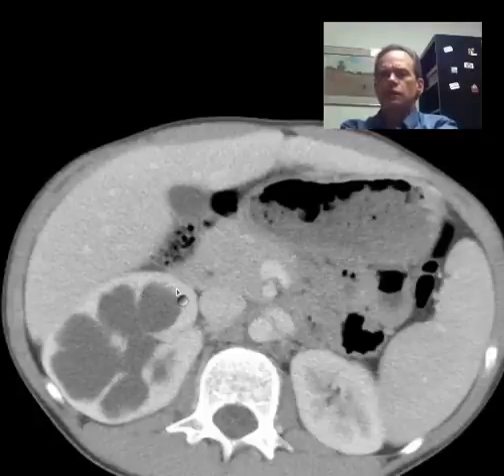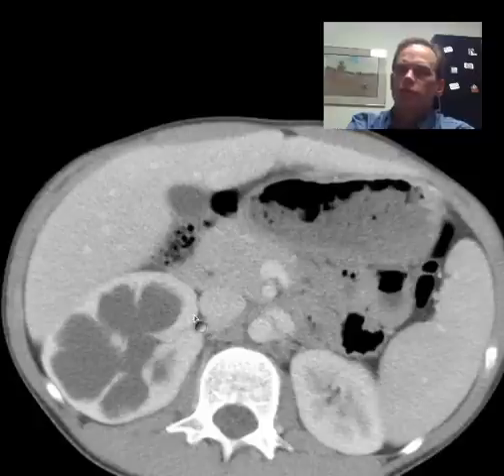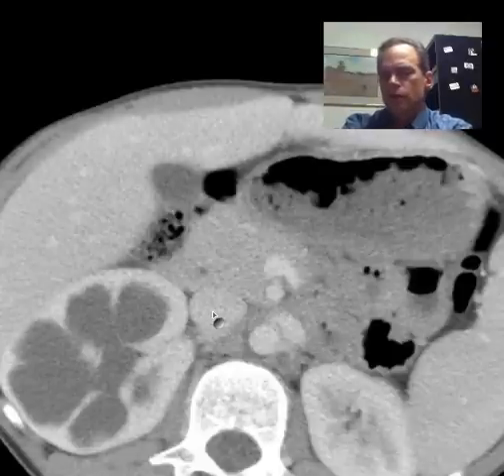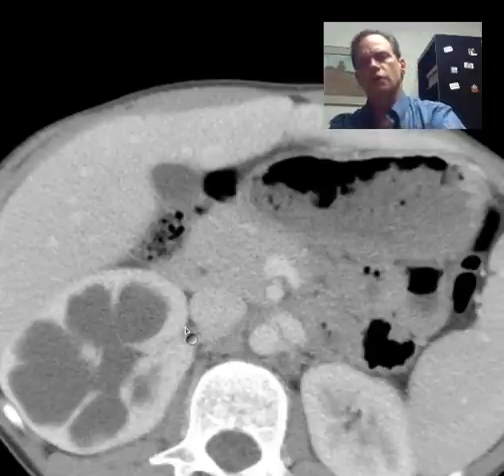And if you look closely, you'll see this is renal cortex, and you see renal cortex over here. Well, they're both enhancing about the same, right? You see that? This is pretty bright, pretty white, light. This cortex on this side and this pretty equal. So what does this represent? What would give this appearance? This is a chronic UPJ obstruction, a chronic ureteropelvic junction obstruction.